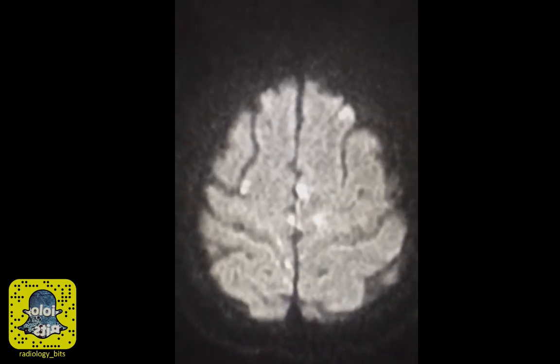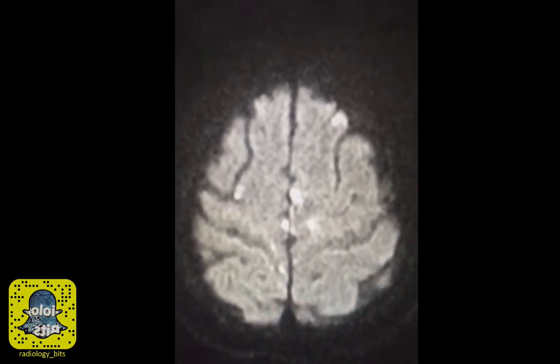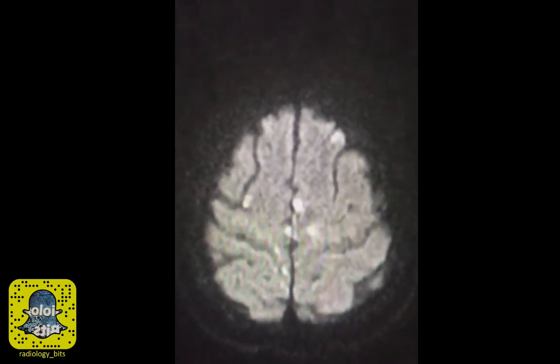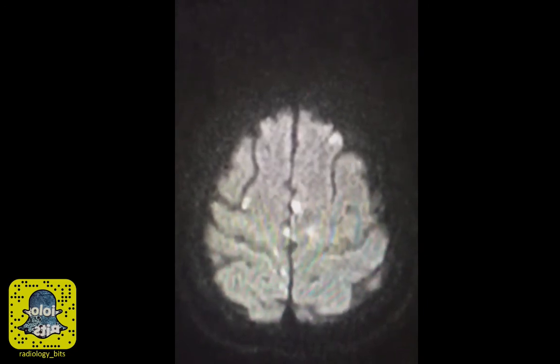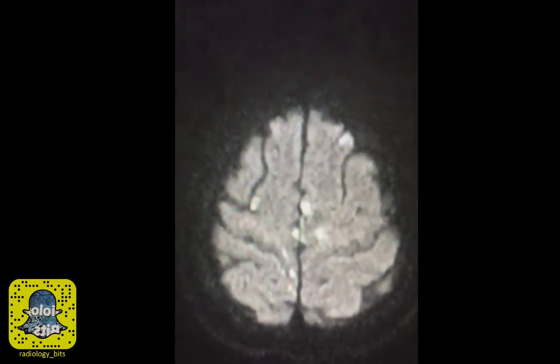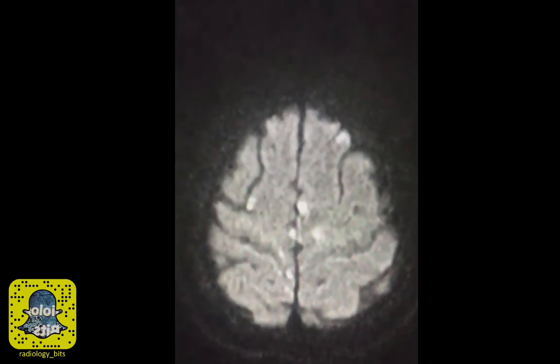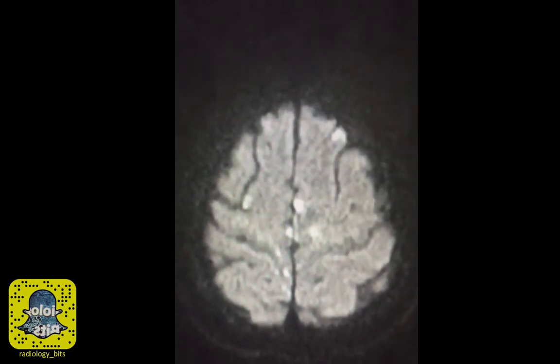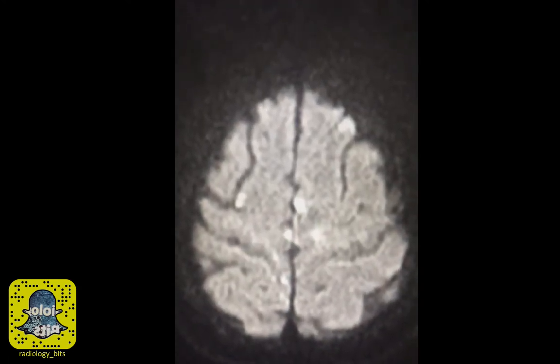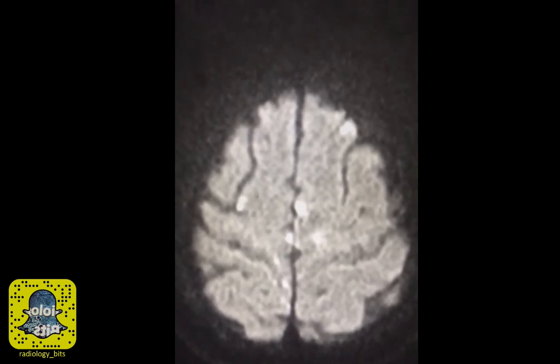So seniors, what have we learned from this case? The first thing is that restricted diffusion is commonly, but not always, due to your typical infarcts. And if you have infarctions that are distributed in multiple vascular locations, think about a cardioembolic stroke. If a cardioembolic stroke is excluded, think about other possibilities, one of which should include vasculitis. Vasculitis could be primary or secondary, confined to the brain or involving other organs, and that's a different discussion. Remember that involvement of multiple vascular areas in cortical and immediate subcortical locations suggests vasculitis as well.